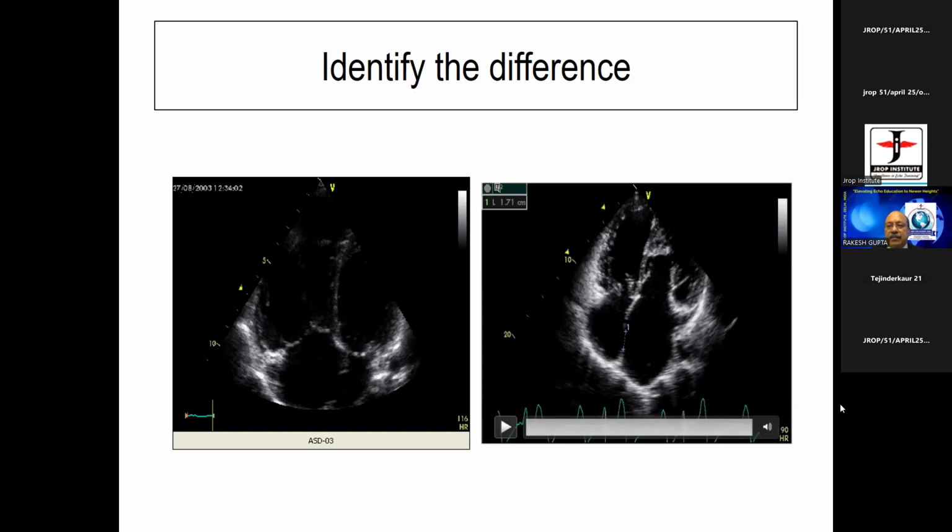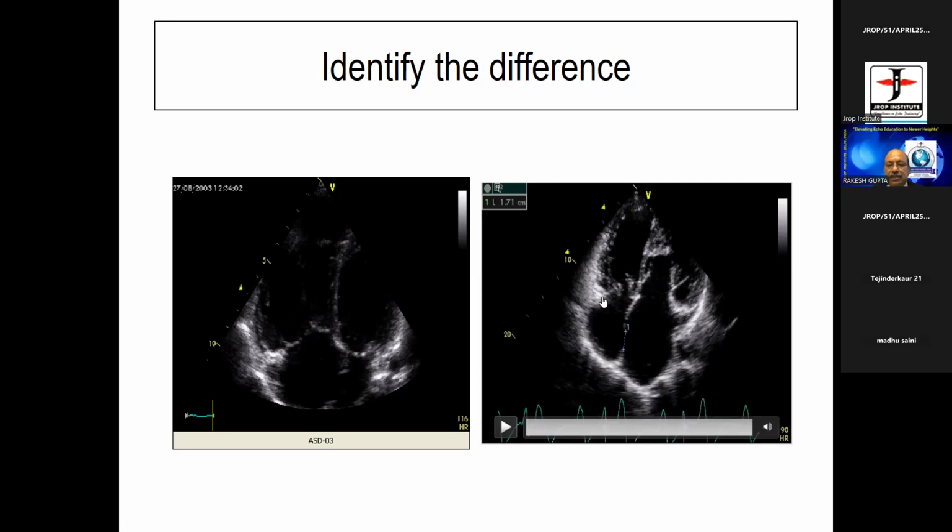The mitral valve is apically placed, I think so. This is what apically placed is? Yes, sir. Correct. This is basally placed. Look at the hinge point of this valve. This is basally placed. This is apically placed. Correct? Yes, sir. All right. Good answer. Now tell me, is this LV or is this LV?